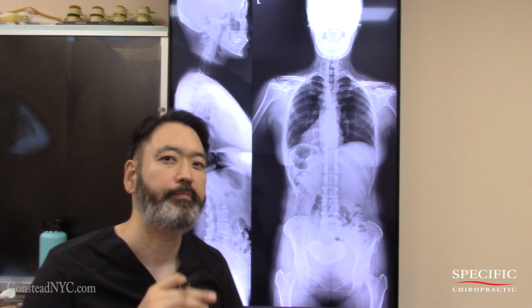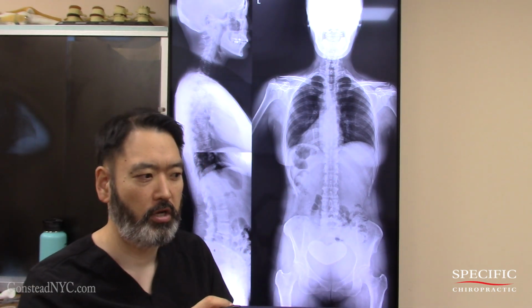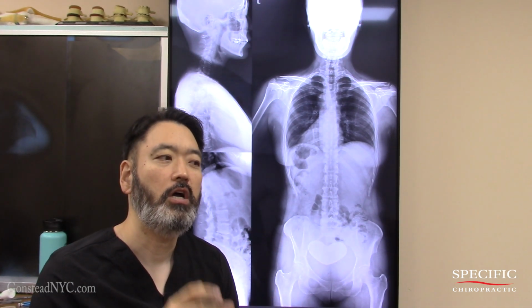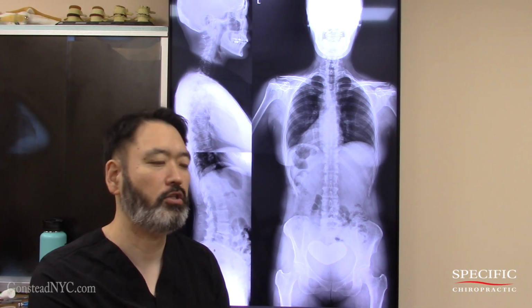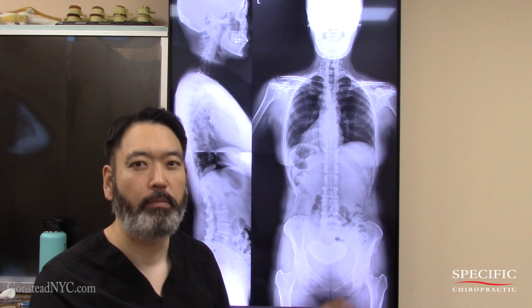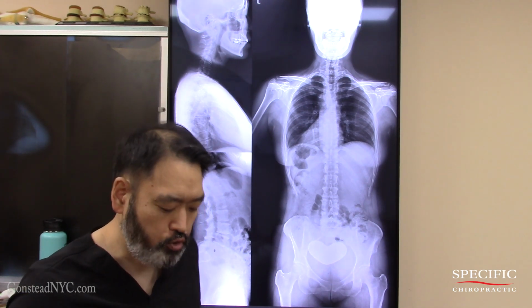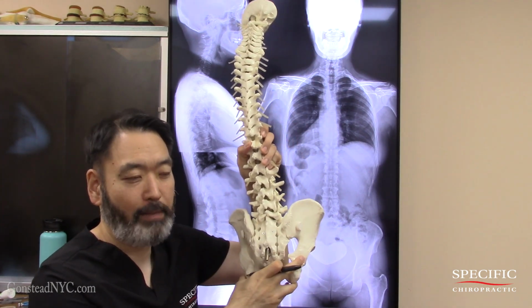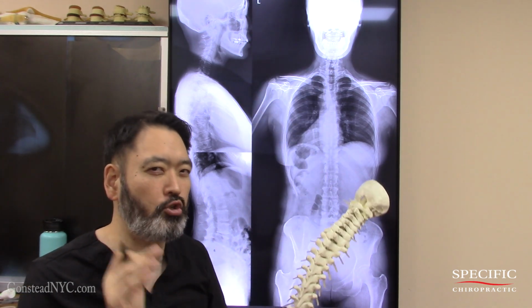But here's the thing. Even if we put 7 millimeters, the reason why we want to keep an eye on the patient is because if this patient was sedentary, that means an office worker sitting at a desk 8 hours, from a 9-to-5 job all day long, then sure, the 7 millimeters should do the trick. But if we're dealing with an athlete, someone who jogs a lot, or especially in her case, a ballroom dancer, because the body is trying to adapt and get more nerve function, it may readapt to the point that even 7 millimeters may be too high.